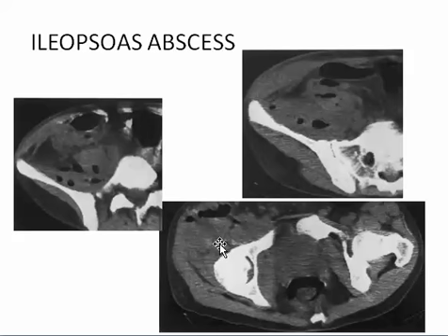This one is extension of this one and that one. Iliopsoas abscess can result starting from the psoas muscle and extends to bulge at the inguinal region, with of course gas formation denoting gas-forming collection, or denoting perforation of a viscus, or denoting abnormal air location due to injections or aspiration.